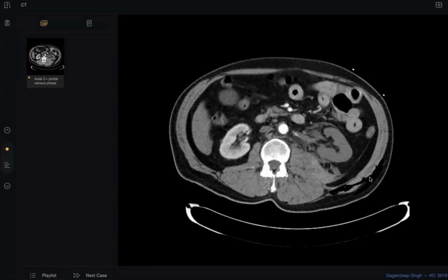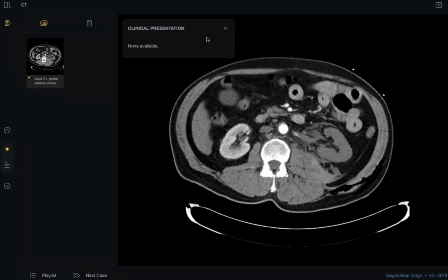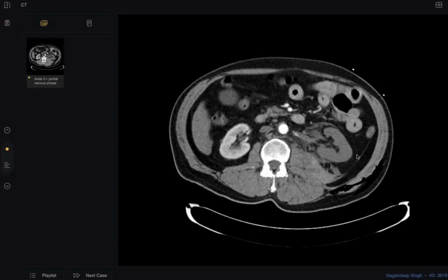What's the indication when you see surgical emphysema like this in a patient like this? What are you thinking could be? I'm asking for the history. If there is no possible history, renal biopsy, or this is post-traumatic. Excellent. Compare this by this, please.